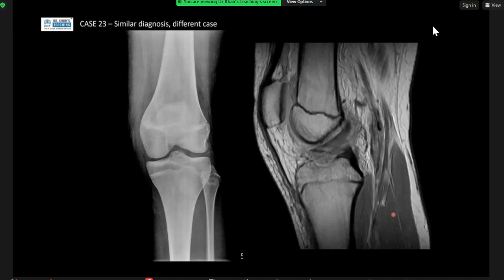Injuries. It's an avulsion fracture at the tibial spine, at the insertion of the ACL. Yes. So this is quite a satisfying one when you're seeing it in your trauma pile, because you can see it quite nicely. The tibial spine is irregular. There will be quite a bit of soft tissue swelling, and a twisting mechanism of injury. And often, if there's a lot of joint effusion, you want to make sure that you do an MR.